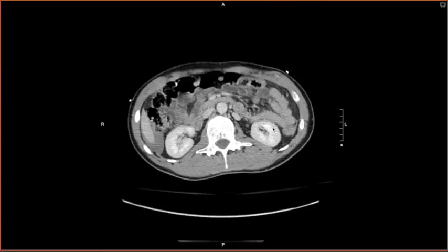Okay, so now we understand the basic radiographic densities. We have ballpark figures for them, and we've demonstrated them on a real non-contrast abdominal CT scan. So now let's apply it. These actual numbers are important, and I'll give you two clinical examples here.